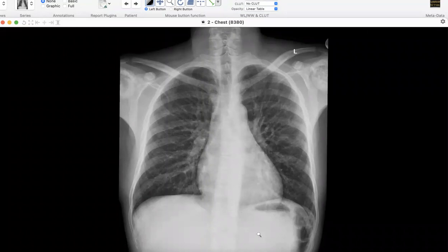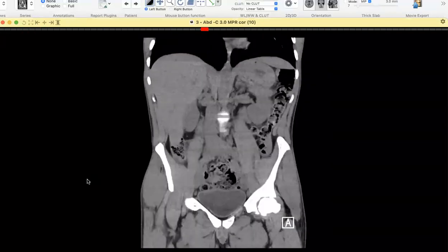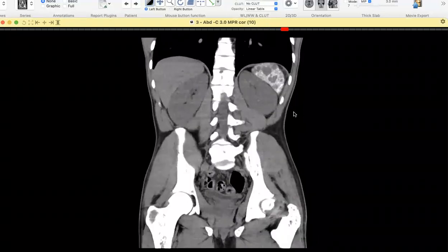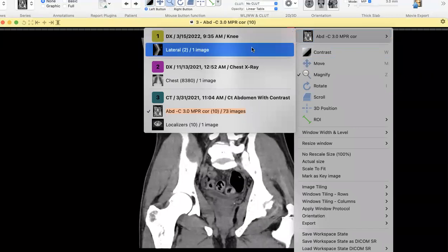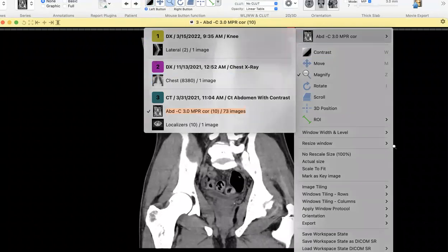The only thing you missed is here, the left splenic flexure. Yeah, so this is autosplenectomy. This is a CT of this patient just to show how an autosplenectomy looks. But calcification does not appear on the X-ray. Yeah, the calcification is not appearing. I think the X-ray was taken even later. The spleen had completely disappeared at that point.